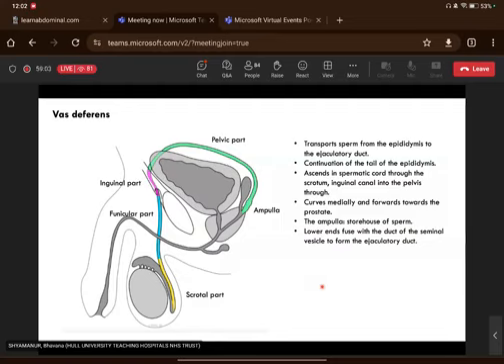And if you come a bit higher, at the level of the bladder base, you start to see the seminal vesicles, so that helps as well. If you are much lower, more distally, and it is tricky, also look for other things that can help, like the soft tissues. Can you make out the labia majora in women? And if it's a male CT, can you see part of the penis coming in? So I think it can be tricky, but try to look for anything that you can find to help you.